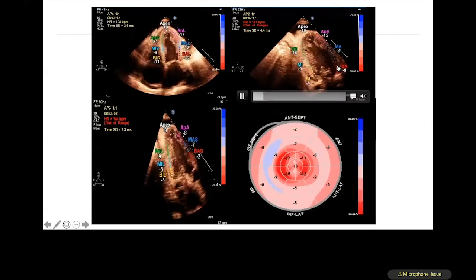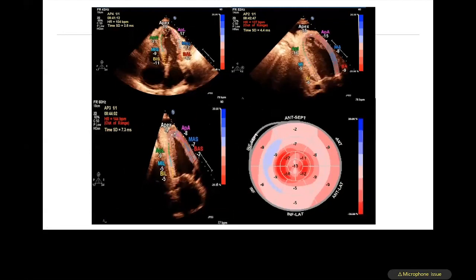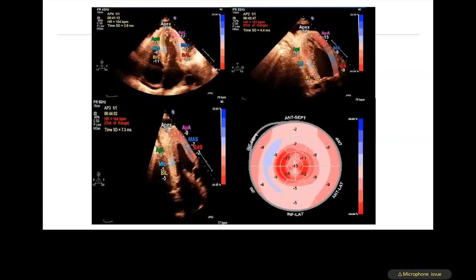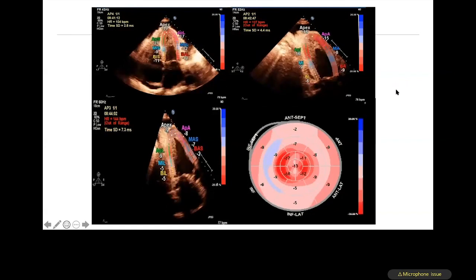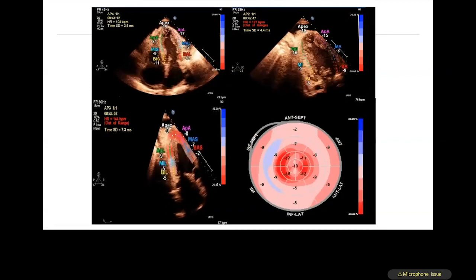So this is a patient who, if you apply the strain features, indicates some form of infiltrated myocardium, like, for example, cardiac amyloidosis. And this patient has elevated right atrial pressures, left atrial pressures, and pleural effusion. The patient is in heart failure. This is very consistent with restrictive cardiomyopathy, for example with an infiltrative disease, rather than constrictive pericarditis.